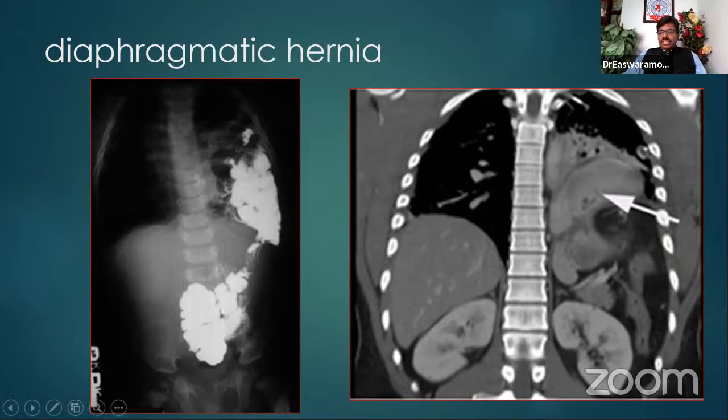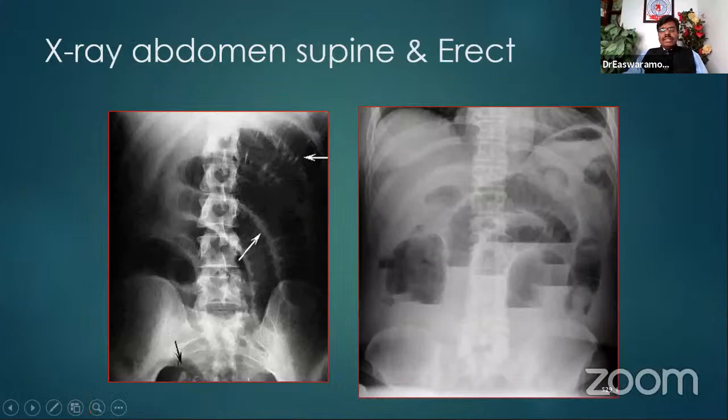Then let us go to the next thing. Here is the next important thing we discussed, especially when we had a patient with small bowel disease. This particular patient was a 25-year-old lady who had a cesarean section, then an ectopic operation, two operations already in the past.